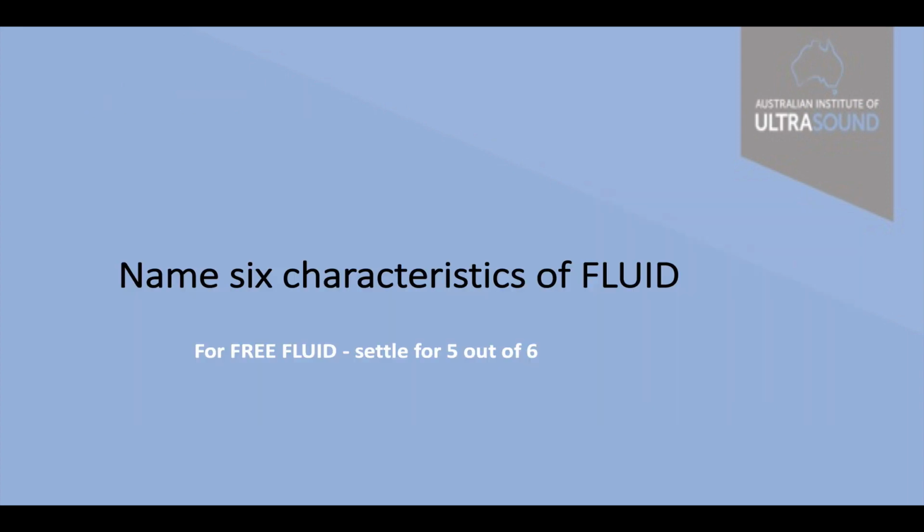So let's recap. We're talking about at least 6 characteristics of fluid and a couple more that may decide whether they're free fluid or not. Remember, fluid itself doesn't have any shape. It conforms to the shape of the container. Secondly, it responds easily to deformation.